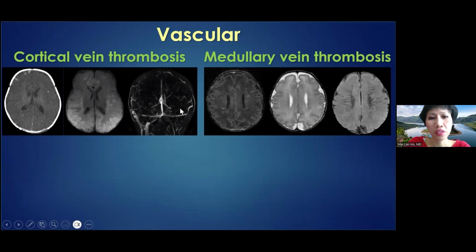So basically there was diffuse venous sinus thrombosis, and then you had secondary arterialization, because if you get impaired venous outflow over time, the pressures build up, and then you get little petechial hemorrhages, right? The capillaries rupture, and then the pressures get so high for venous outflow that you start to get secondary arterialization. So there's no large artery distribution because the entire brain is infarcting, right, from a long-standing venous thrombosis. So very important to remember this diagnosis.